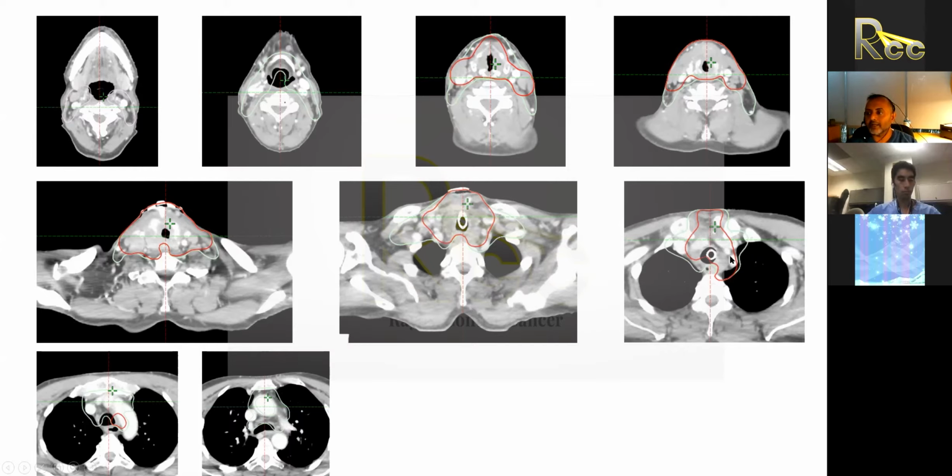And then similarly now coming down here in the anterior mediastinum, when you start seeing patients that have significant involvement of the anterior mediastinum, you really have to treat this volume all the way very close to the skin surface. And so you can see here, this is right in the parasternal region, right above your manubrium. You can see that these volumes are going all the way out to the skin, because really there's no anatomic barrier here, especially when this patient already has gross disease right here. And then you can see that here, I did make an attempt to carve out the esophagus, fully well knowing that my esophageal doses are still going to be fairly high, but I wanted to try to spare the esophagus in this patient if I could.